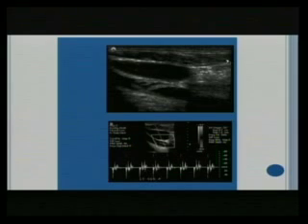So they've given one example here about this particular patient. I want you to look at the waveform. There is no waveform that we spoke about. I mean, this could be a systolic peak, but the diastolic reversal is occurring earlier than systole. So this is a very bizarre appearing waveform, where the diastolic reversal appears first, then systole occurs, then there's nothing.